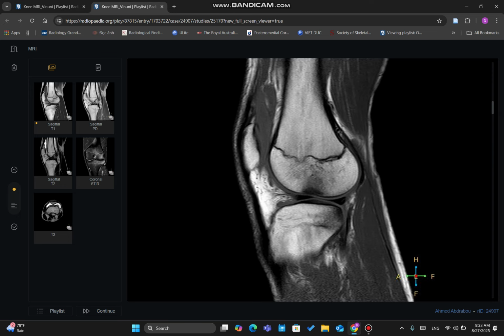This point collided with this point due to a kind of translation or dislocation. You can see clearly that this point cannot randomly collide with this point if there is no dislocation or translation.